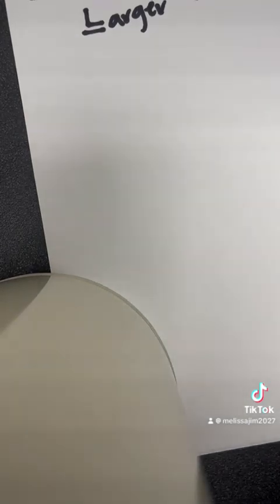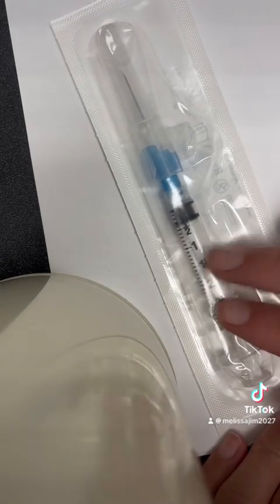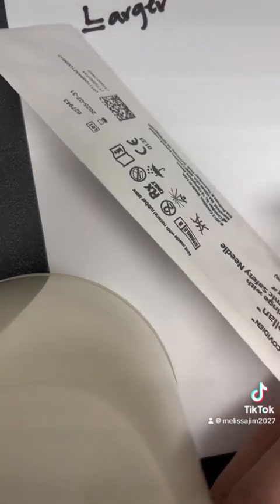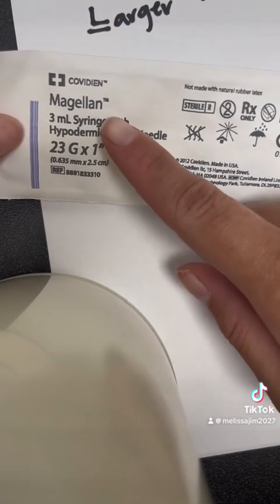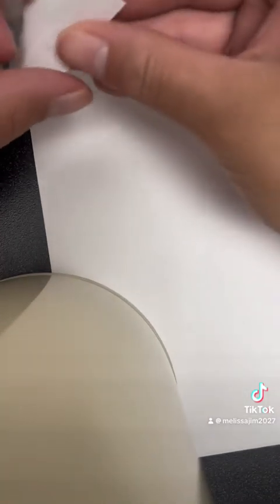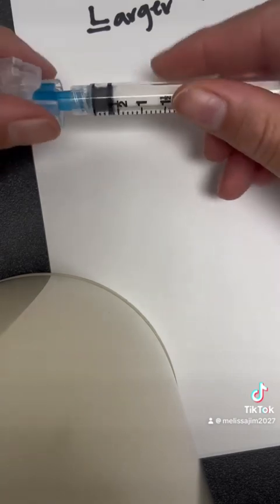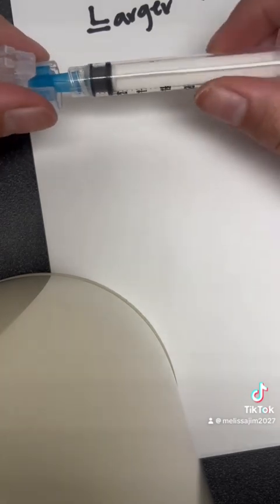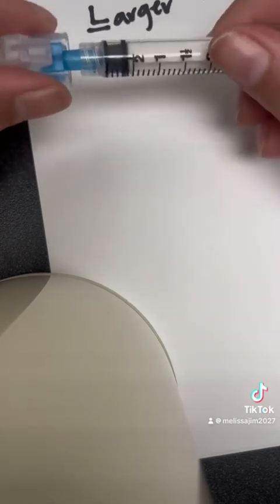Another way we might see our needles too is they might already be connected to a syringe here. And again, on our label, it will say what size of needle that is and the size of our syringe. Whenever we are using this type of syringe and needle, you just really need to make sure that you are still locking it in properly because they are going to be loosely put together. And so if you don't lock it in, it will come out.